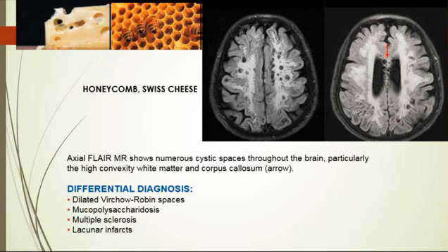This may be seen with the mucopolysaccharidosis, in which the enzyme deficiency results in the accumulation of metabolites in the perivascular spaces, dilating them. Okay, giving this cribriform appearance. Within the white matter, corpus callosum, and basal ganglia, toxic intracellular substrates can lead to cerebral atrophy, gliosis. MS can show diffuse punctate, usually less than 2 millimeter Virchow-Robin spaces. They describe it as sand-like appearance, very tiny holes. Okay, lacunar infarcts are usually larger, more than 5 millimeter, and less symmetric in distribution.